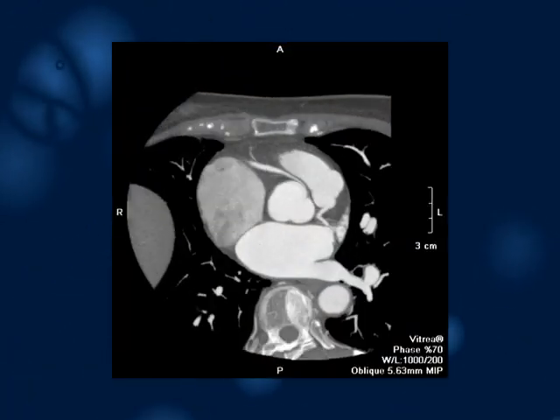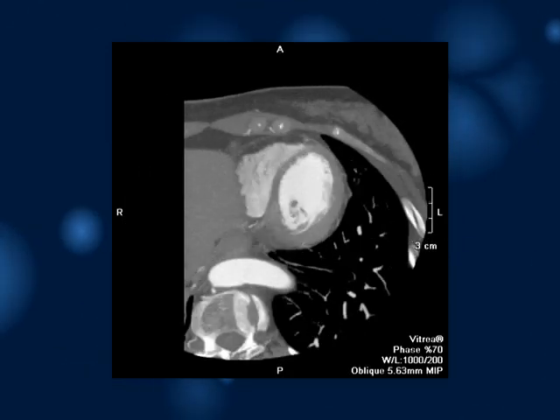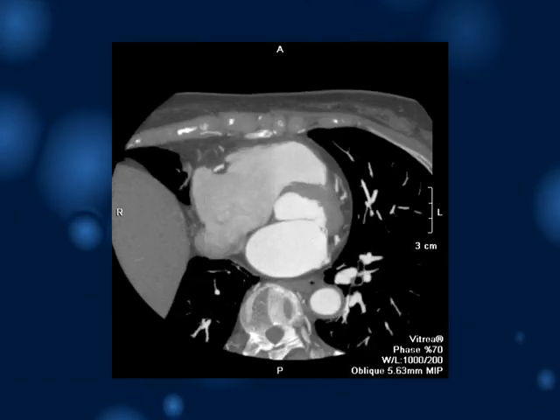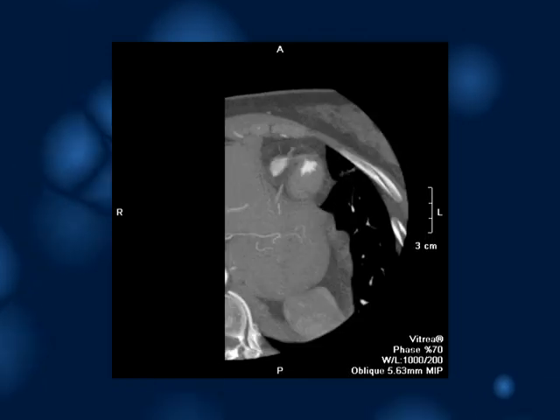Coronary arteries now are best seen by CTA, in which imaging of both the coronary arteries and the associated structures can be well identified, leaving little doubt for the true course and pathway of the anomalous coronary artery.